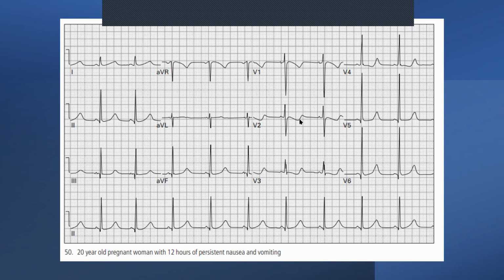So biphasic T waves, especially like this, where it's down and up, normally represents hypokalemia, all right? And up and down normally represents something we call Wellens syndrome, which is a cardiac marker for sudden cardiac death and cardiac arrhythmias. But so that's down, up. The first one is up and then it goes down. That's biphasic. And in this case, it's down and up, which is normally indicative of hypokalemia, which is again fitting in with our diagnosis that we've come through so far.